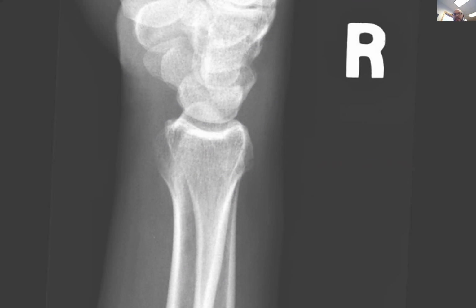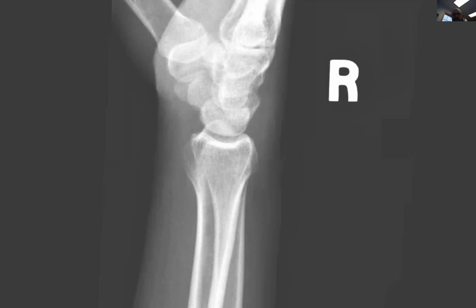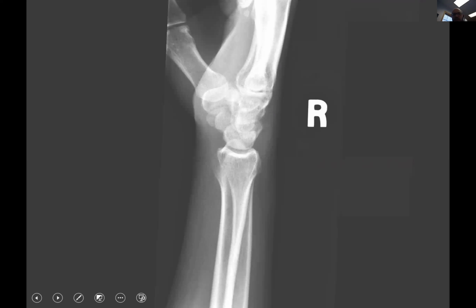On the back side of that wrist. Is everyone still here? You can see the fracture line all the way through. Right at the very back of the radius, take a look. I'm going to circle it and outline it right there. There's a separate ossicle right back. There's cortical offset. Now let me blow it up so you can see it.